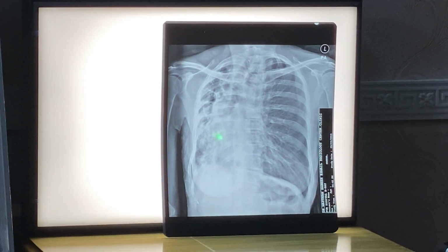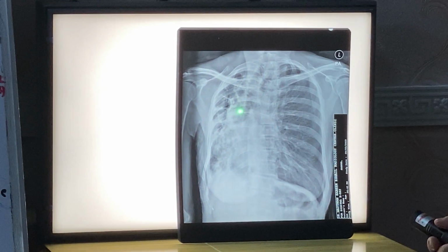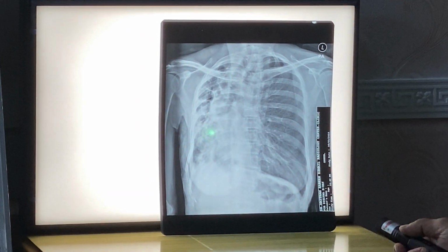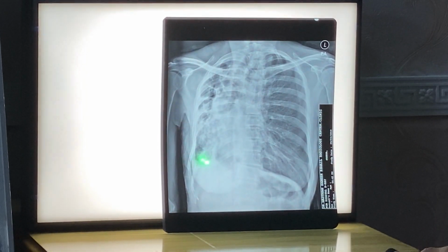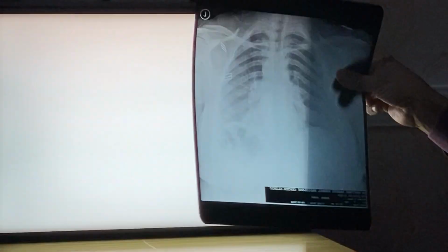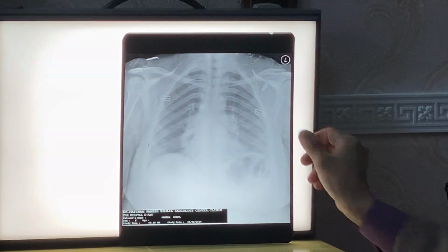Somebody said it could be a tumor. The other said it could be pulmonary TB because of fibrotic band, calcification and pleural effusion. How can we differentiate? First, from history, and second, from a CT.